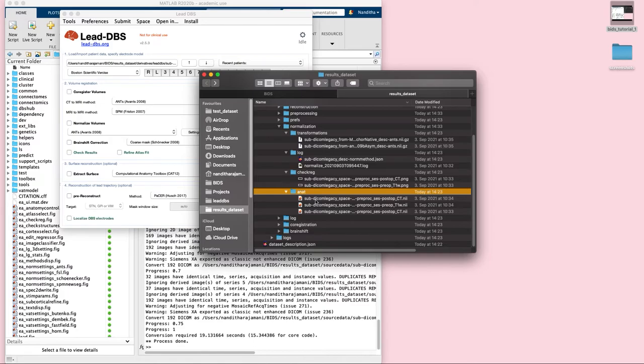Also a specific note on the file name. So you can see that the file name itself has changed. Initially inside the normalization folder would be glanat, for example, but here the file name is more BIDSified. The anatomy of a BIDS file name is the presence of various tags.